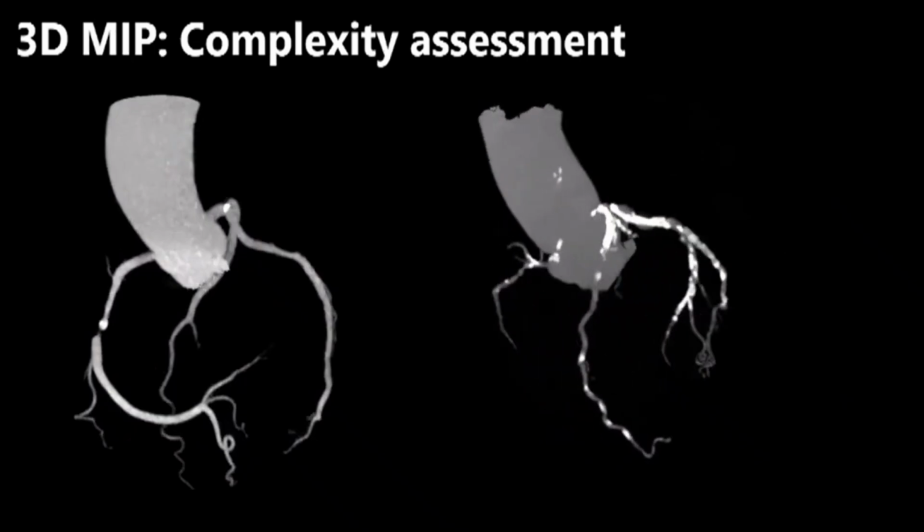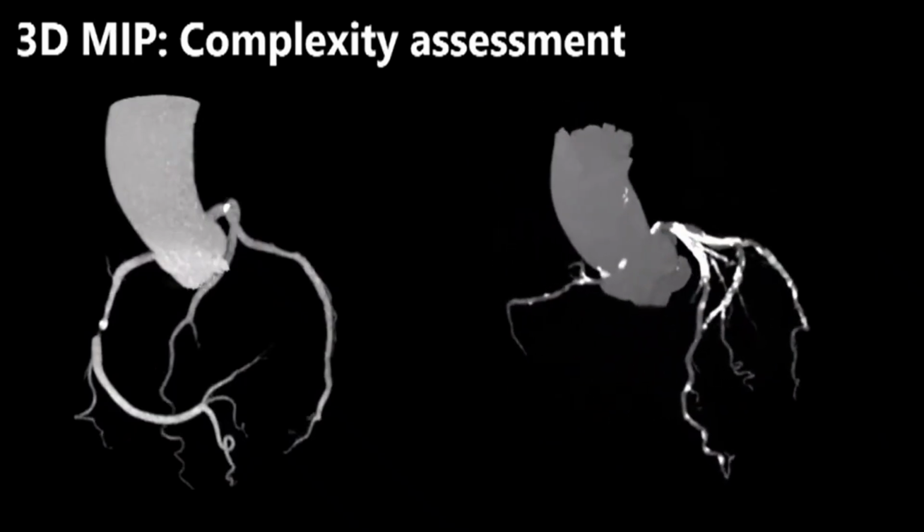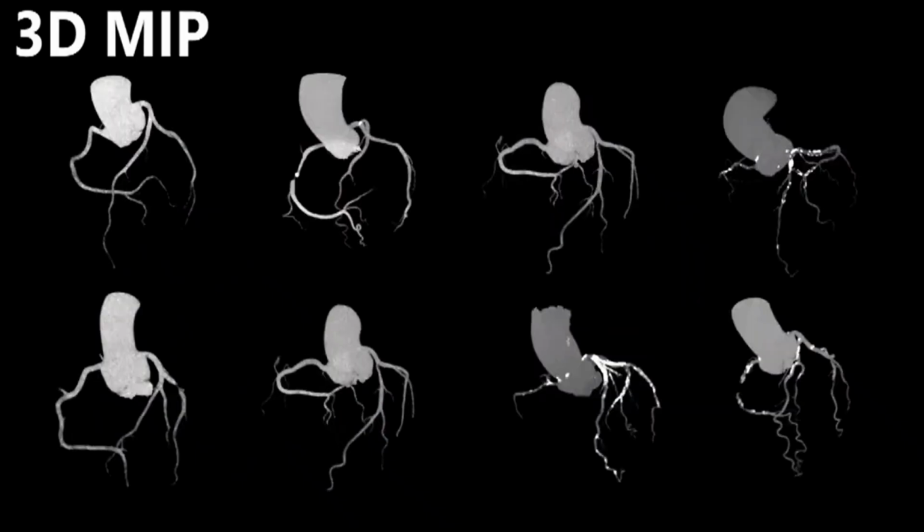On the other side, you have severe calcifications. These cases are probably going to involve calcium modifying techniques like lithotripsy or shockwave. So it gives you a sense of what you need to do coming into the procedure, and that's why this is so useful for interventionalists.